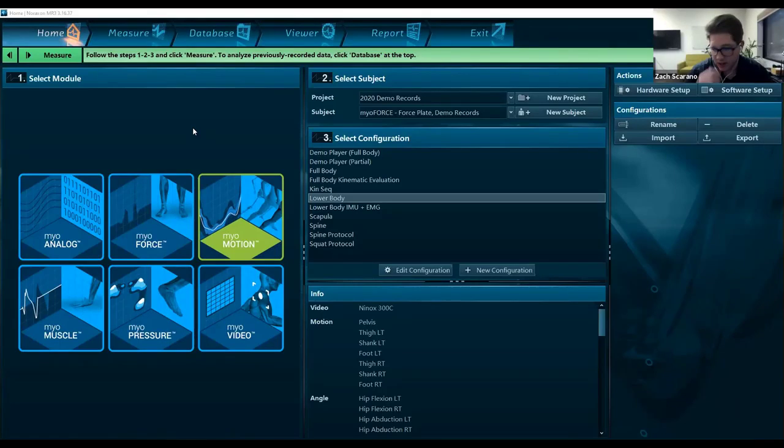And so for this particular one, you'll be able to reference this into the future and take a stab at creating some of your own custom reports utilizing the different options that we've got available. So we'll go ahead and get started.